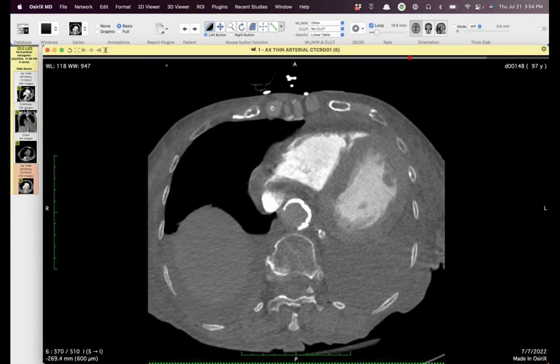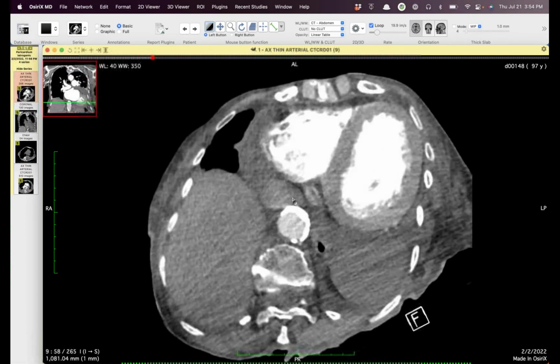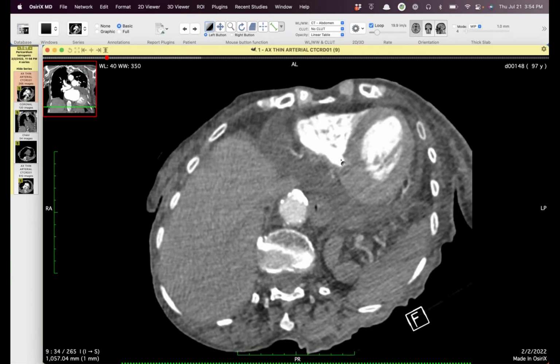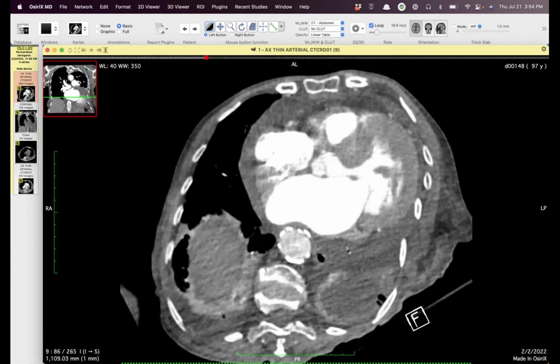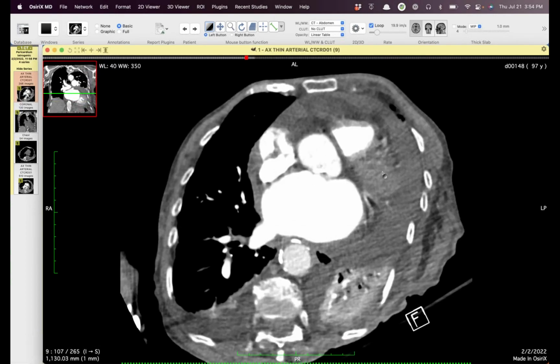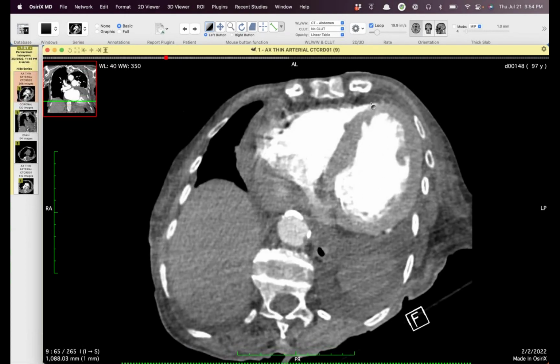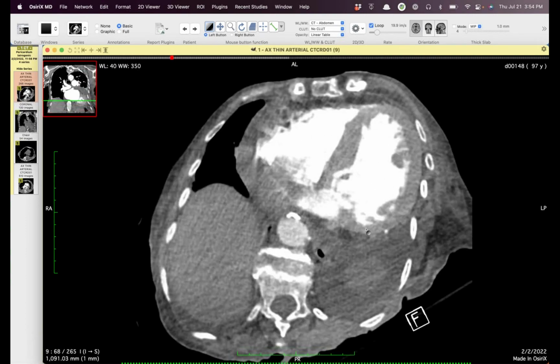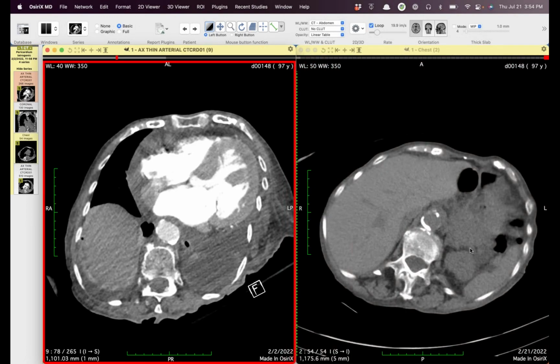This case goes back a few months. So this is February, and notice that there is no pseudoaneurysm there, as we would suspect. I was digging through because I saw that it said likely from resuscitation. And then looking back, she has a pericardial effusion at this time. It's moderate volume, but there's not really anything anterior. There's some inferior to the heart, but most of it's posterior and here.